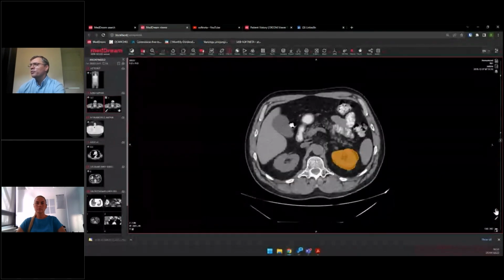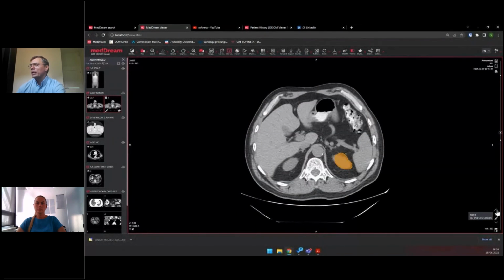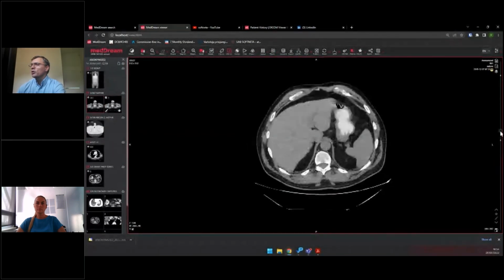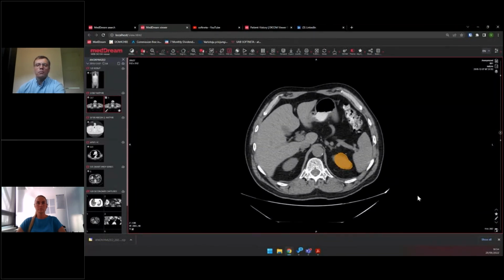Now I'm going only through the critical images, and I can always check the annotations or selections. If I select it, I can go and see all annotations, everything. So it's very easy. You don't need to search. You don't even need to look at the selection on the right where it is marked, because you can use hotkeys to switch between these critical images and always see all annotation changes in these images. I hope this answers well.